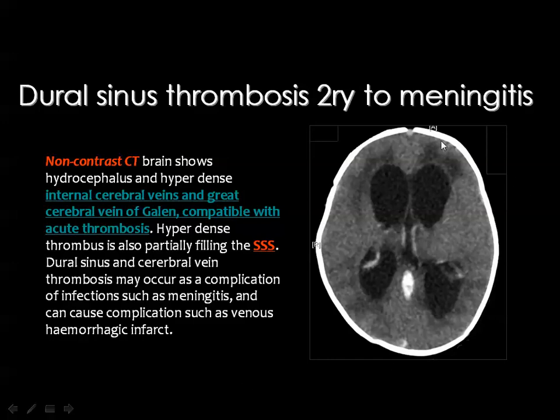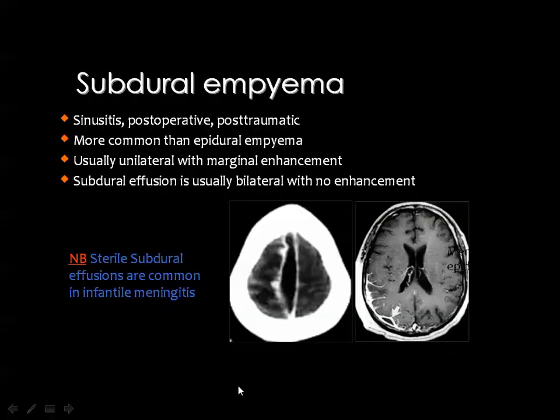And in order to see the inflamed meninges, you have to inject the contrast media. Then, as a sequela of meningitis, pus may accumulate outside the dura, resulting in an epidural elliptical shaped collection with enhancing margins representing an epidural empyema. And you know, a collection or blood in the interhemispheric fissure or along the tentorial leaflet should be in the subdural space because there is no epidural space here.